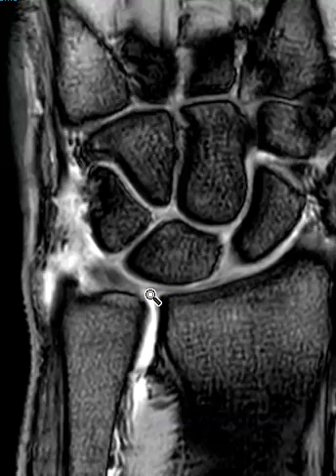And right here in between, we should see at the midpoint the central disc. It's just a little cartilaginous area, and we do not see that little fibrocartilaginous band. We see fluid going right up into it. Along the top it looks like it may be intact, but along the undersurface it looks like there's definitely a tear. So it looks like a high-grade, partial thickness tear along the undersurface of the central disc.